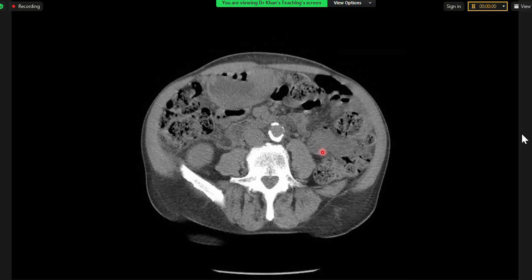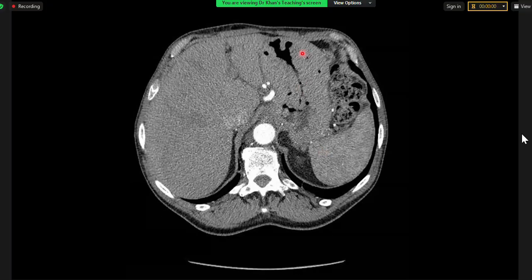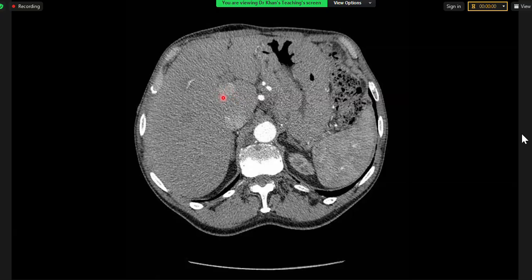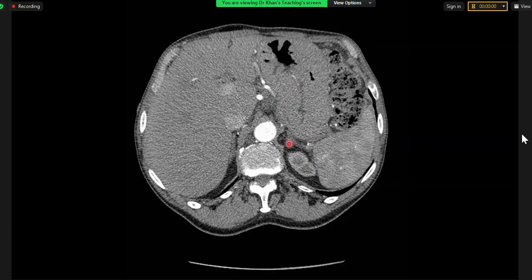And then we have got axial arterial. Please remember we did a CTA in this case because of the clinical question, they had asked for that. On this, you can see this enhancing lesion. Now this is metastasis. This should be taken as worrying for a metastasis. Carcinoid metastasis, remember, also enhances, and look, this is rugal thickening. I'll come back to this on post-contrast.